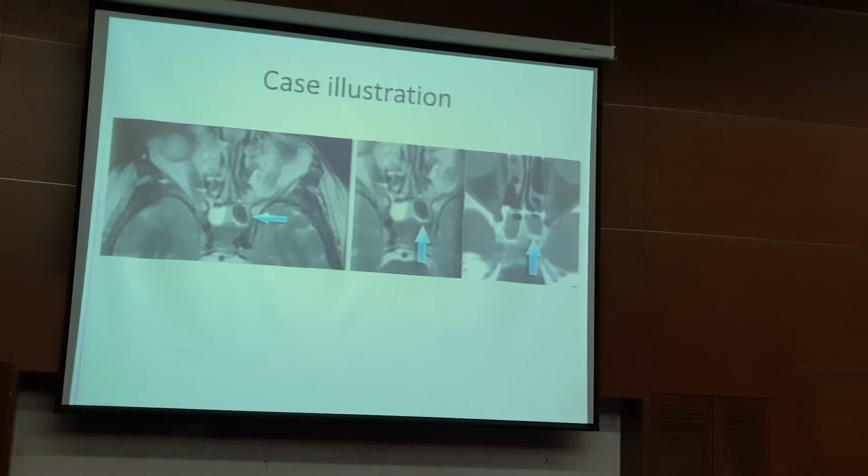Okay, you can see that there is fluid within, so we know that this is not a normal sphenoid sinus, but a sinus which contains high protein content, most likely fungal infection. Fungal does this. It will appear hypo on T1 and hypo on T2.